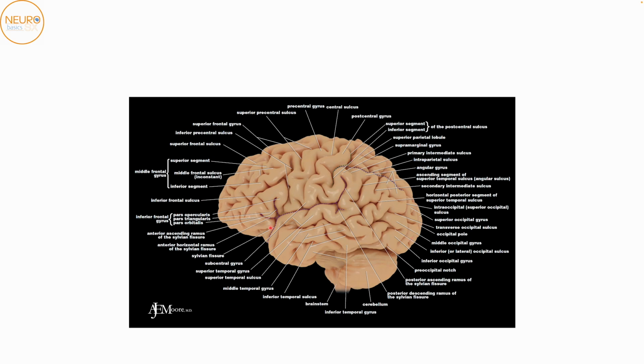The other important thing is that the inferior frontal gyrus on the dorsolateral surface has 3 important parts. You have a pars triangularis, which is over here. You have a pars opercularis, and then you have a pars orbitalis, which is anteriorly located. The sylvian fissure divides these different parts using an anterior ramus and an ascending ramus. So first you have the orbitalis, then you have the triangularis, and then you have the pars opercularis. The pars opercularis on the left side is Broca's area.